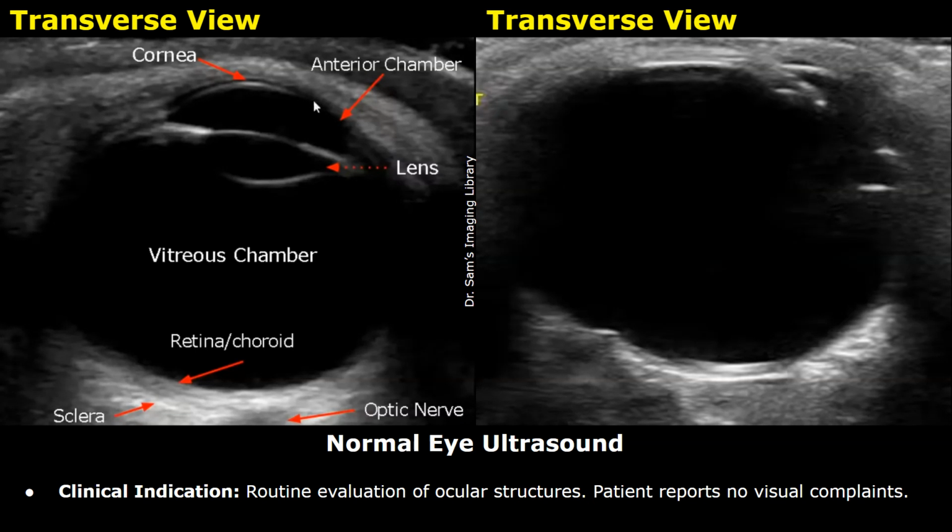Hello everyone, this is Dr. Sam and this video is about eye ultrasound reporting. You will learn how to write ultrasound reports regarding eye pathologies. The first report is of a normal eye ultrasound.